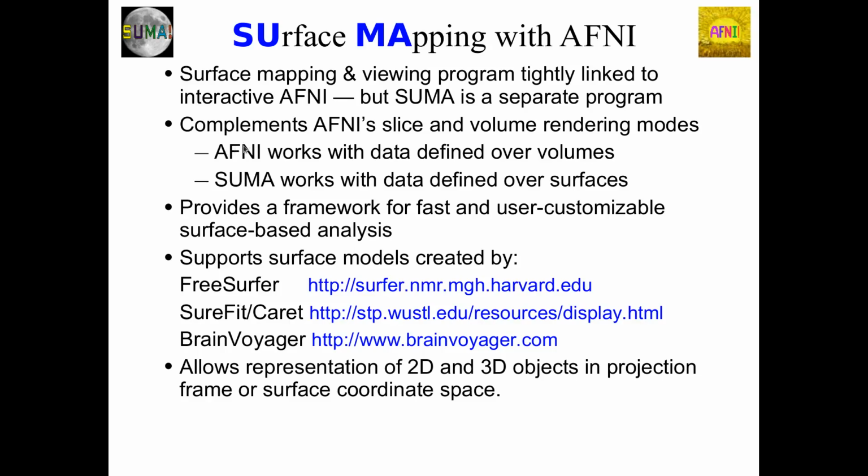And when we mostly refer to AFNI functionality, we'll talk about volumetric data sets, NIFTI, brickhead format type things. And SUMA, we'll talk about surfaces, GIFTI data sets, NIML-D sets, and some other things like that.